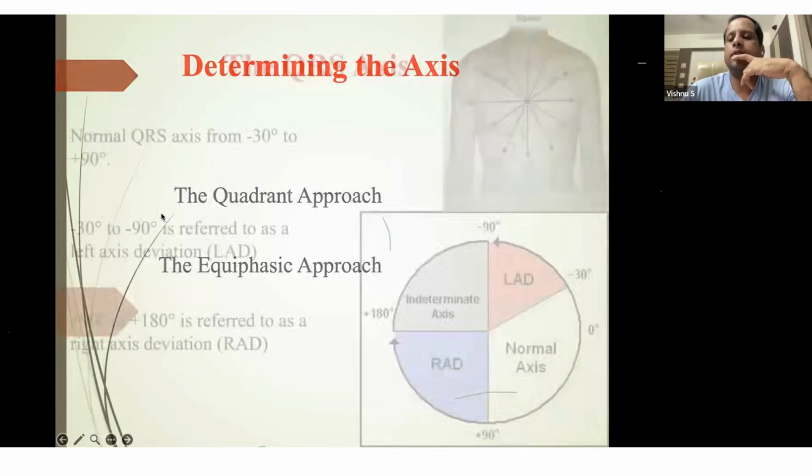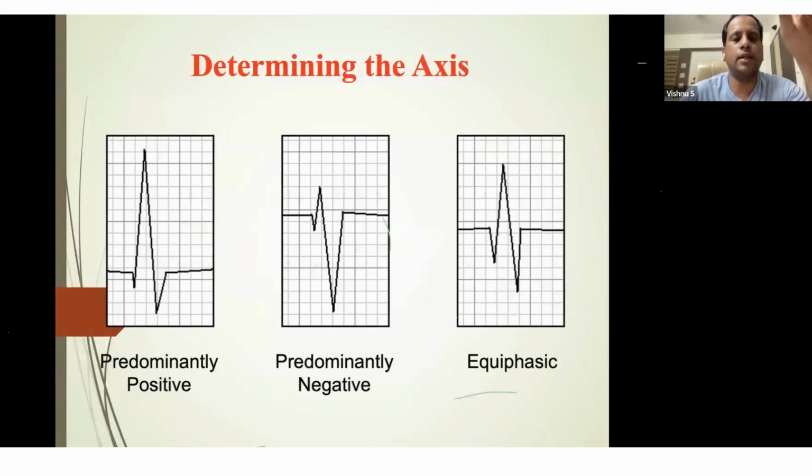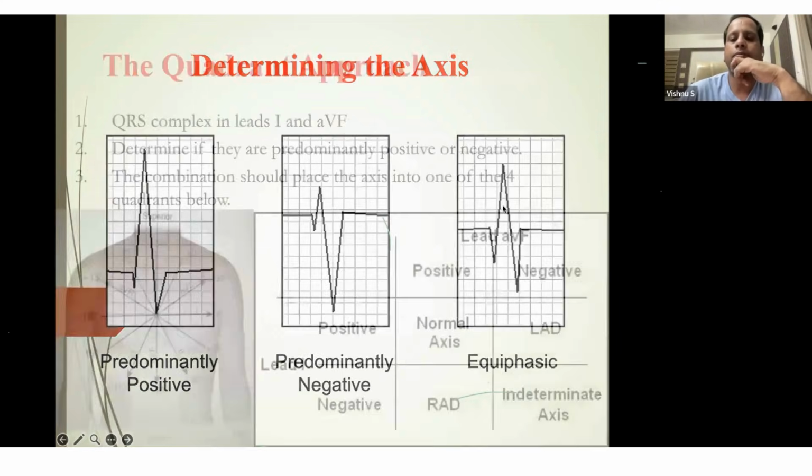So you go back to this picture, lead 1. You mark 1, 2, 3, 4, 5. This point you can mark for lead 1. Then again you go back to the example, you marked lead 1, and now you are seeing the AVF. You assume that this is the AVF lead, and you calculate the small squares, 1, 2, 3, 4, 5, and you see 1, 2, 3, 4, 5. This can be taken as 4. So the net is plus 1 in the AVF.